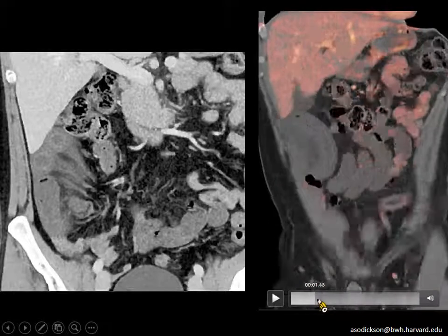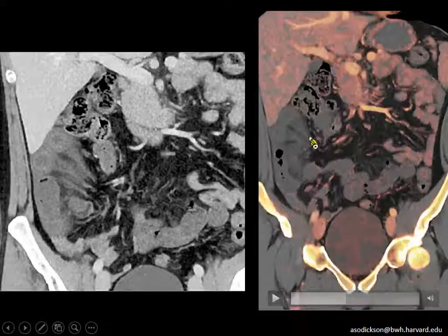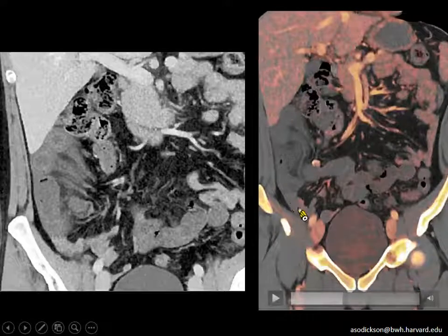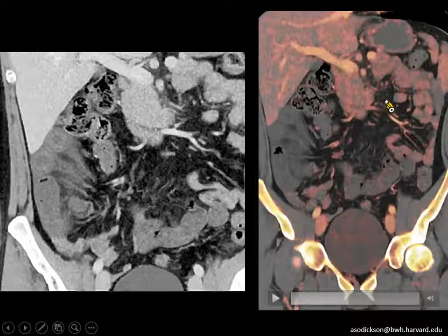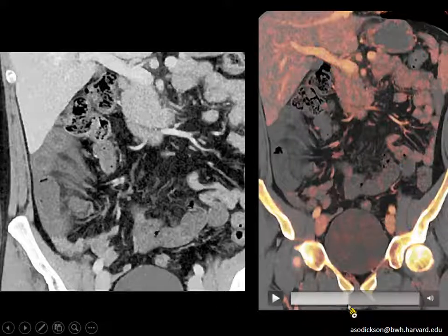Now here we happen to do this patient with a dual energy acquisition, and I hope I can convince you that there is no orange color within these loops compared to the distal loops. Tough case because we don't see a large amount of enhancement within the distal loops either here. We certainly do see some enhancement in the jejunum, but it's quite common to see a bit more iodine content within the wall of the jejunum than the ileum. So we do want to compare with a similar portion of the bowel.